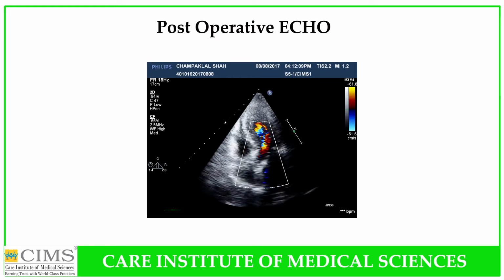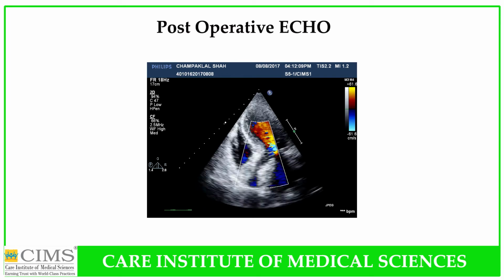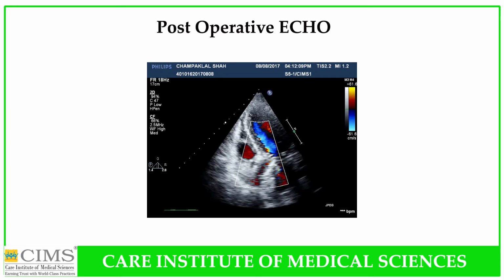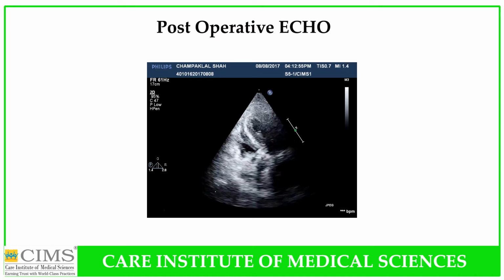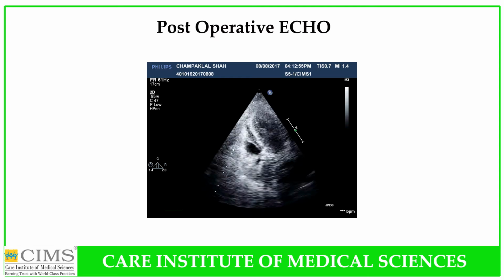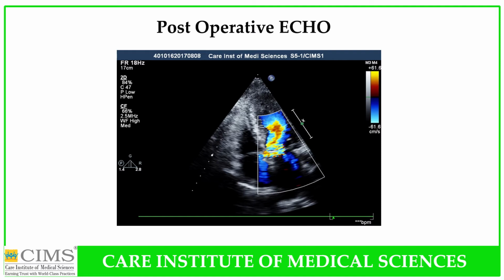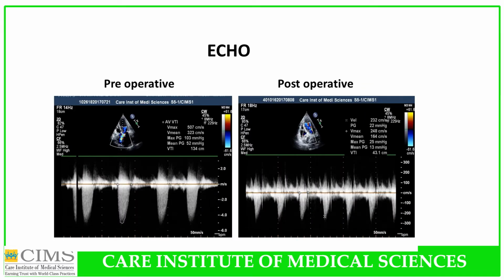This is the post-operative echo, and it shows resolution of the gradient and a patent aortic valve, bioprosthetic TAVI valve. This is another image of the post-operative echo. Final pre and post-operative Doppler gradient shows resolution of the gradient across the aortic valve.